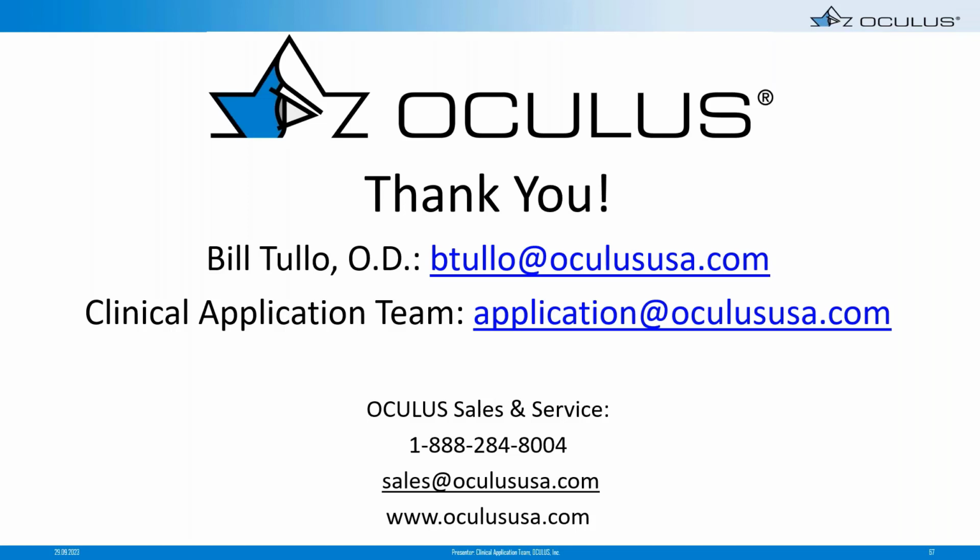On the other hand, if you've just taken out a contact lens, maybe right prior to the examination, and you get a yellow or red final D, I think that could certainly be a false positive that you would not want to rely upon. And again, depending on what kind of lens they were wearing would depend when I would have them back to remeasure.